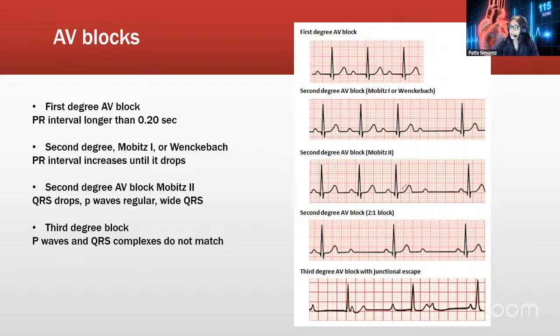All right, so let's take a look at Mobitz 2, or second degree AV block. As we said before, just like the one before, it is missing a QRS, just looking at the strip right off the bat. Now, the difference between Mobitz 1 and Mobitz 2 is that the PR interval is not longer on Mobitz 2. If we look at this strip, it is actually the same on every complex here. P, QRS complex, the PR interval remains the same. It does not get longer. It does not modify. It's the same across all the beats.